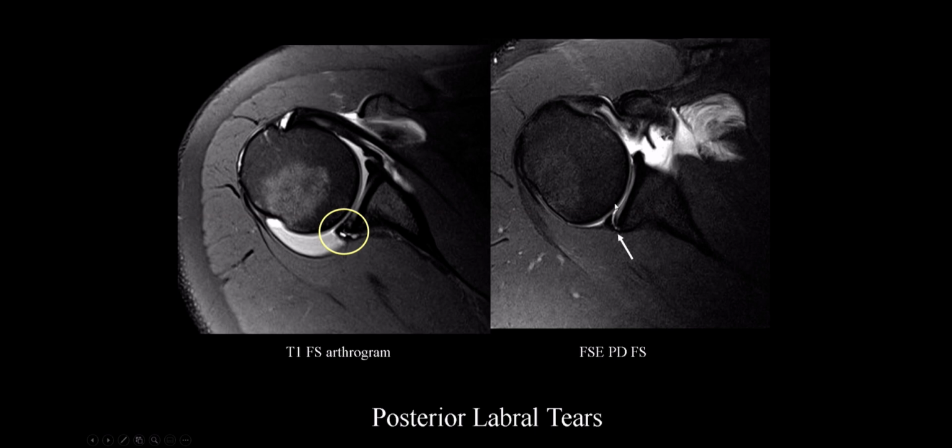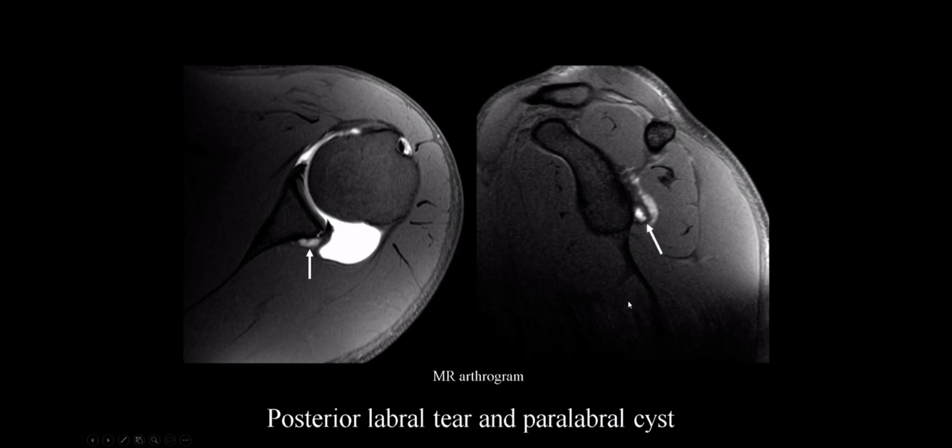Here's a different case, detachment all the way back. You feel very confident. It doesn't have to go all the way through the capsule. You just want to make sure it goes all the way through the junction with the cartilage next to it. So if it gets deeper, goes deep to that, that is a definition of a tear.